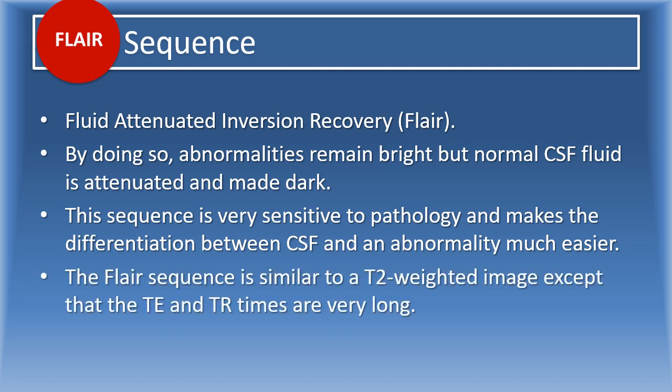This sequence is very sensitive to pathology and makes differentiation between CSF and an abnormality much easier. The FLAIR sequence is similar to the T2 weighted image, but it has a very long TR and TE. We already know that T2 has a long TR and TE, but the FLAIR has a very long TR and TE.